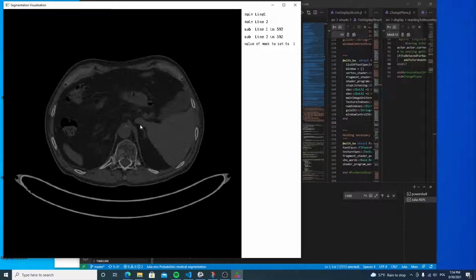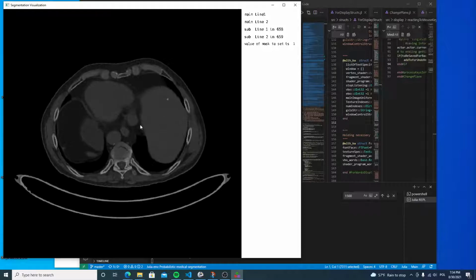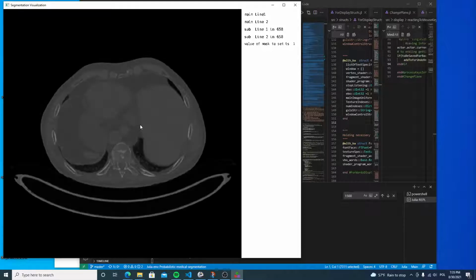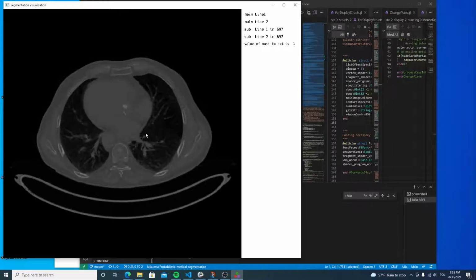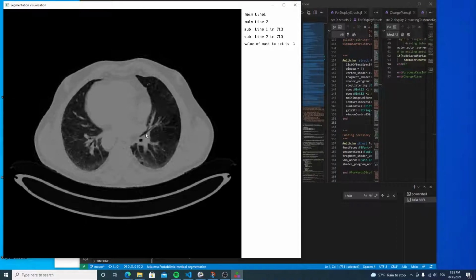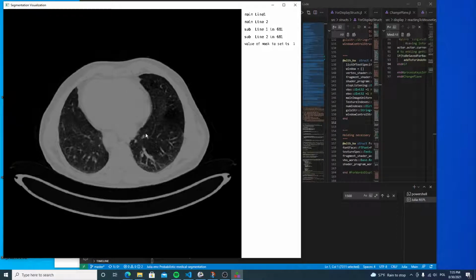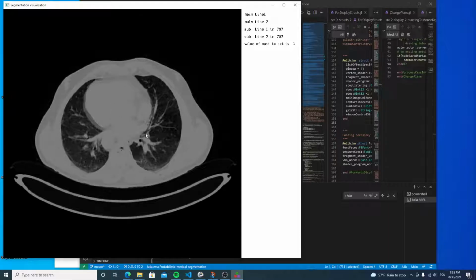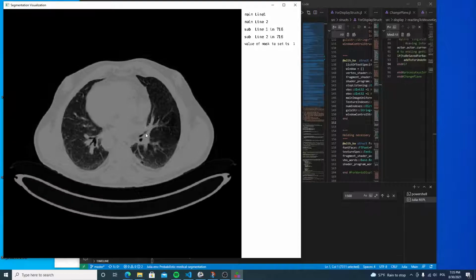This is a soft tissue window. In order to change the window, we can press, for example, F1, and then we can see bones nicely, and F3 to get a better view of lungs. We can also, of course, make some custom modifications to this. These are the most important things that one can modify.